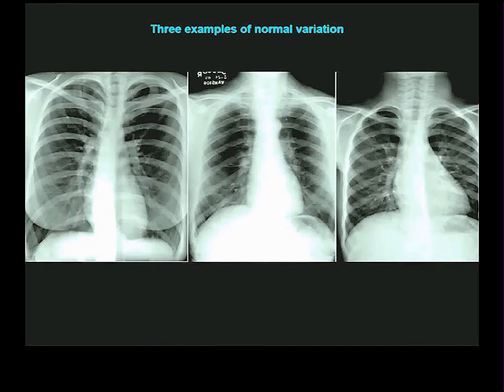Not only do these people's hearts look different, even though they're quite normal, this person has something here that these 2 people do not have. That's because this person is a woman. And these are the shadows of the breast. Even though breast tissue, unless you're actually lactating, is mainly fat, and even though fat density is pretty low, if you have large breasts, that adds up and gives you a noticeable density where the breast is. So these are 2 men and 1 woman.